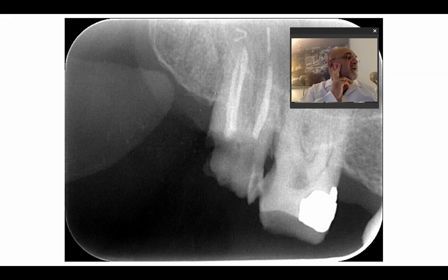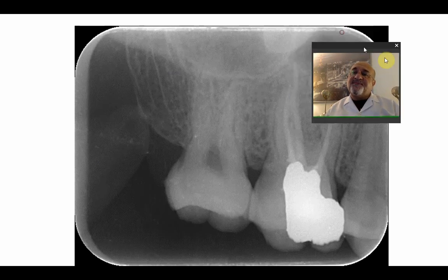When the patient opens, the coronoid process moves downwards and forwards. So when the patient opens, the coronoid process will be in the way between the x-ray and the teeth. So it will appear as such, especially in patients with a large coronoid process. This triangular portion is the coronoid process of the mandible.